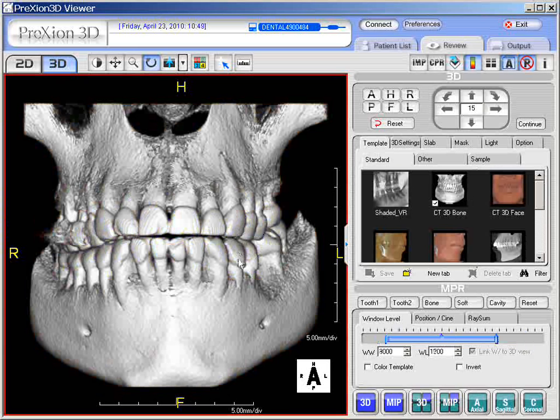And that is as good as any template that you can apply for looking at the 3D image. But it's all personal preference. Feel free to play with these templates on the right, change the pages, and play around with the default setting and also with the thresholding, and see if doing some of your cases that changing the templates will help you with certain diagnostic capabilities.